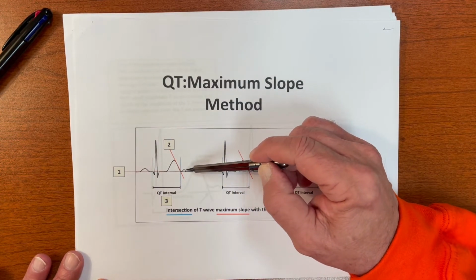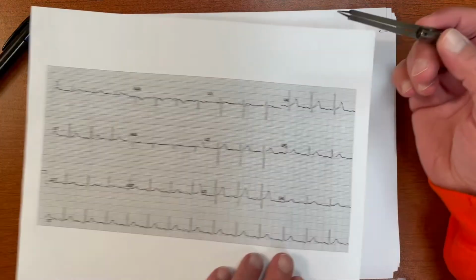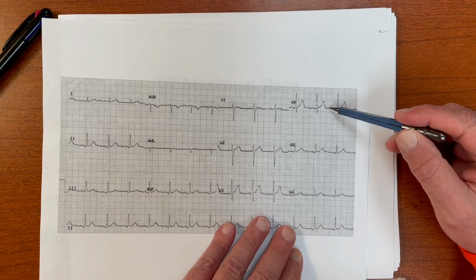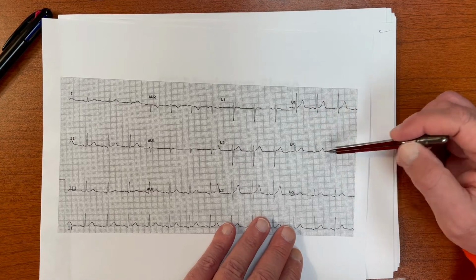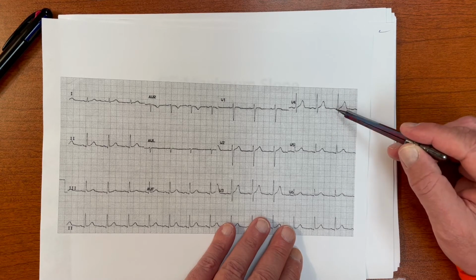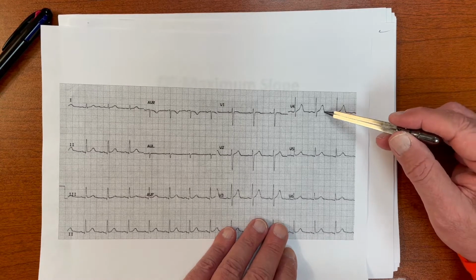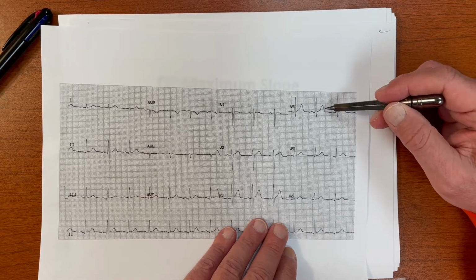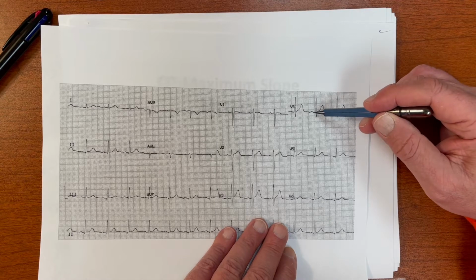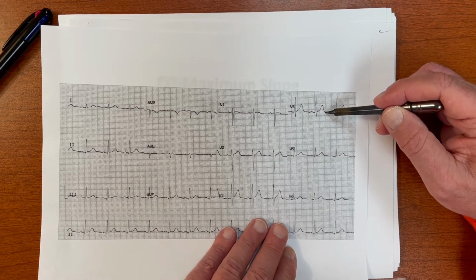If you look at this EKG, P, QRS, T wave, there's a thing called a U wave. The U wave oftentimes is not visible. It's visible at slower heart rates, and on a regular heart rate in a normal EKG, it's visible often in V4 or V5. So there, P, QRS, T, that little thing's a U. That's a P. Okay. Now this is important. Notice that the QT is not from here to there. The QT is here to where that line intersects at the end of the T.